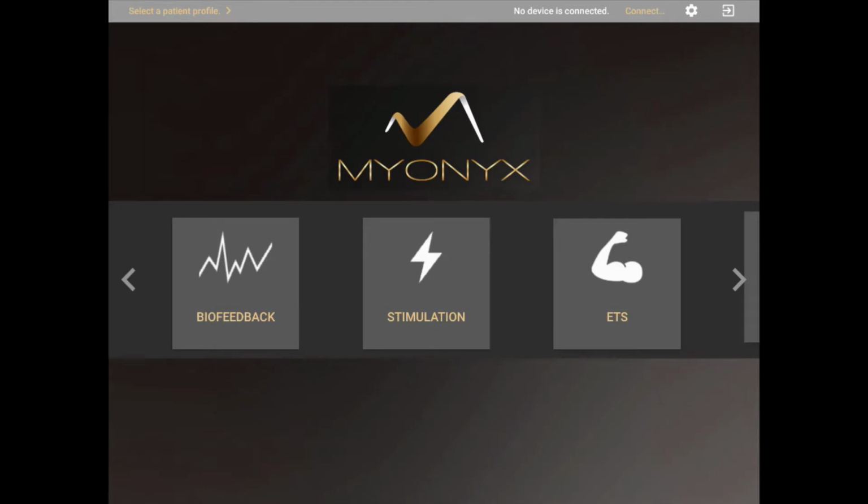If this is your first time using the app, you will have to first select the MyOnyx device you would like to use. You may have several devices connected to the same app. The last device used will always be selected by default when you load the app. The name of the device connected appears on the status bar.